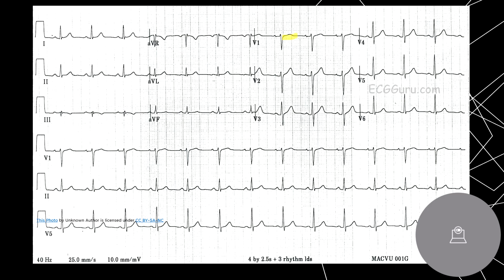And then we'll go, this is the back, this is the front, and that's pretty flat, no problem here. Same thing, let's go to V2, so we're going to knock septal out. There's a T wave. Now this is the back, and this is the front. Pretty flat, no big deal.